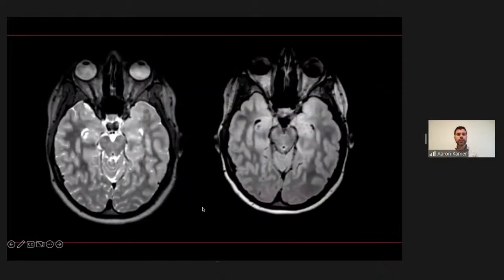All right. So here's an example of a type 1. It's a larger region. You can see that the white matter in the region is a little bit more hyperintense, and the cortex is a little bit thickened. There's a little bit of blurring of the cortex, and the anterior temporal lobe is a common place to find this abnormality. And sometimes you just have to be really clued into the fact that the patient is an epilepsy patient. And if they have an EEG, you really should be aware of where the EEG is localizing. And if it's a temporal lobe, pay very close attention to this.